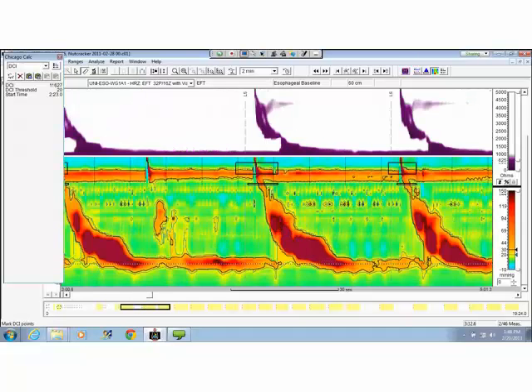Same with these swallows here. If I were going to do a DCI here, under the striated muscle section and down across the entire completion of the peristaltic wave, contraction wave. Does that help answer that question, Tom? Yes, thank you.